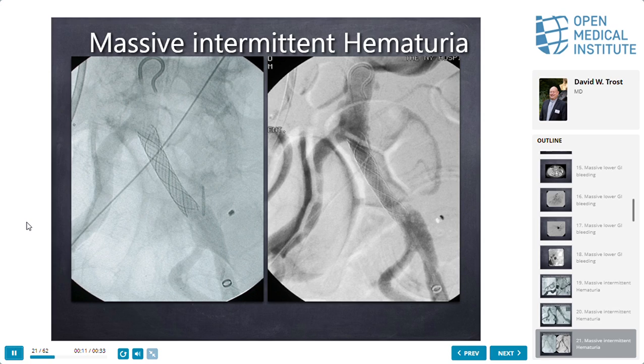So now I've seen this enough times that if I even hear about this, I know what I'm looking for. I don't even bother looking in the kidney for a case. I had another one where we did that angiogram, looked at the kidney, and the kidney had a tumor in it. Oh, it must be the tumor that was bleeding. No, this was the situation.